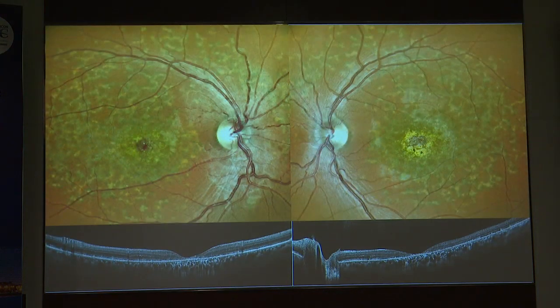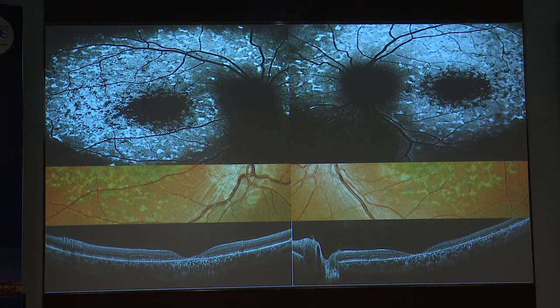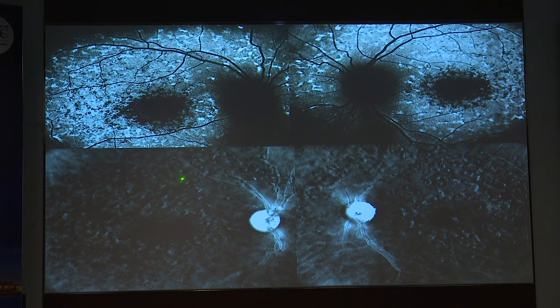Now coming to RPE disease, this is a case of Stargardt disease, classic angio, FAF. Again you see in Stargardt, these are multiple bubble-like RPE changes. And in all this is more classic, you can see. The extent of involvement, if you look at a FAF, is quite less of the RPE, while in this particular retro mode, you see the whole diseased RPE is quite extensive. So it tells you the extent of the disease in a better way.